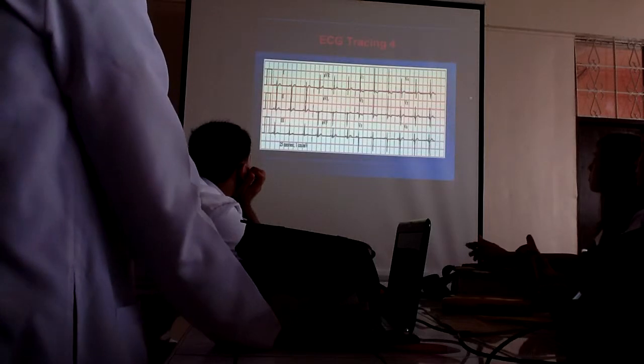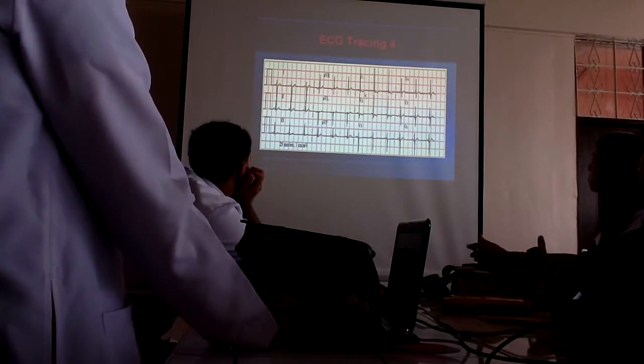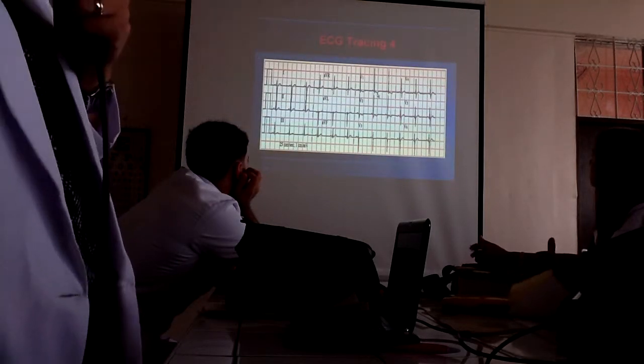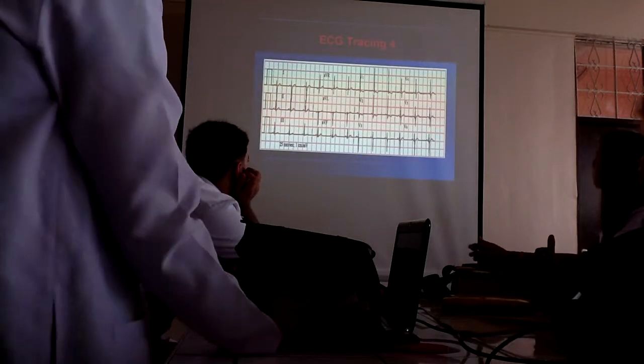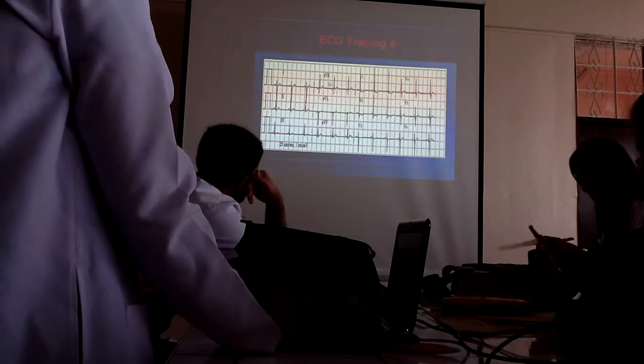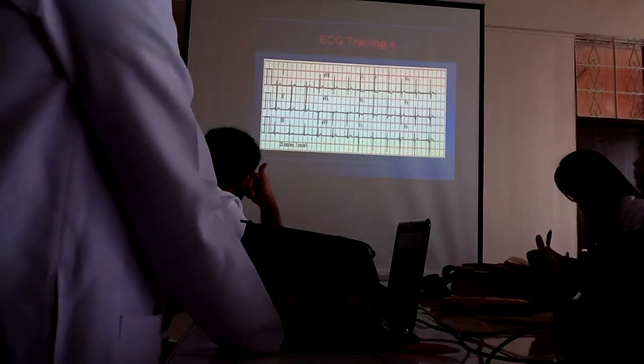Okay, this is wrong. You cannot interpret this as myocardial ischemia, anteroseptal wall, because these T wave inversions are ischemia in ECG interpretation. But you cannot interpret that because this one is wrong. This is upright, when this one should be inverted, and V1 should be inverted.